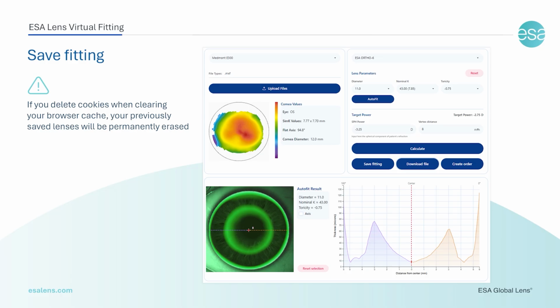To save the virtual fitting, click the Save Fitting button. The lens parameters are stored in your browser's local storage and will remain accessible until the browser cache is cleared. Each subsequent lens you select will also be saved, building a cumulative list of your designs. Please be warned that if you delete cookies and site data when clearing your browser history, all your saved lens designs will be permanently erased.